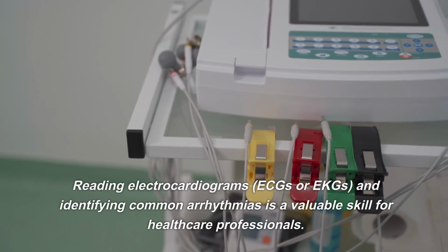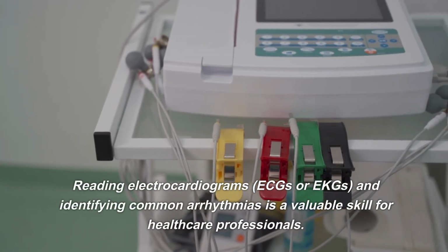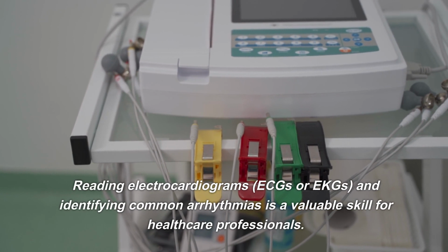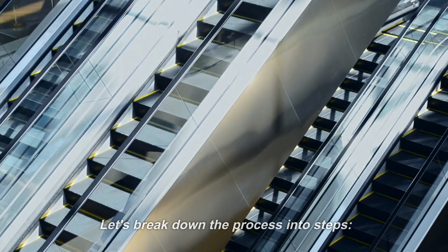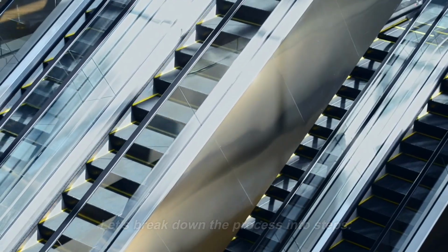Reading electrocardiograms, ECGs or EKGs, and identifying common arrhythmias is a valuable skill for healthcare professionals. Let's break down the process into steps. Part 1. Basics of EKG Interpretation.